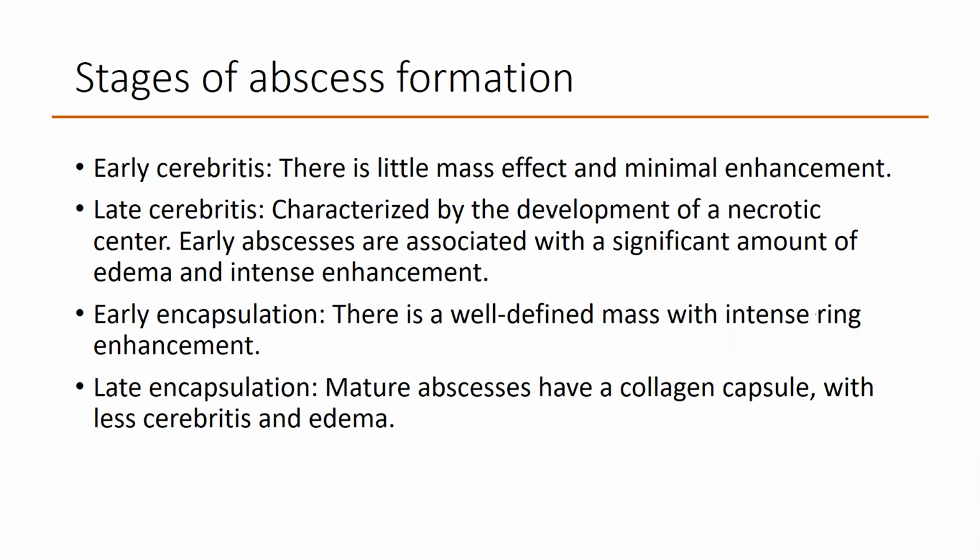One similar thing, like we told earlier in NCC: in the initial vesicular stage of NCC, there is no mass effect, there is minimal enhancement, and the size of the lesion is small. So in early cerebritis also, there is very little mass effect and minimal enhancement. And in the last stage, again, there is less edema and the size also reduces. In the second and third stages, that is late cerebritis and early encapsulation, there will be significant mass effect and enhancement.